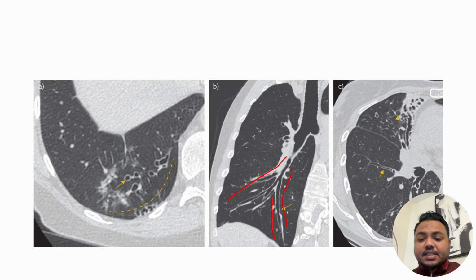Secondly, the bronchial dilatation appears as a signet ring. Basically, if you follow this, each of the bronchi is surrounded by adjacent vessels. That's a vessel, that's a bronchus. Generally, the bronchus should be smaller in size compared to adjacent vessels. But if you have a bronchus which is more dilated than the adjacent vessel, then it appears as a signet ring, just like this.